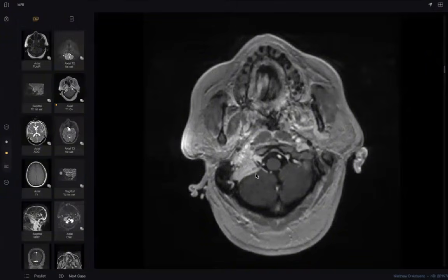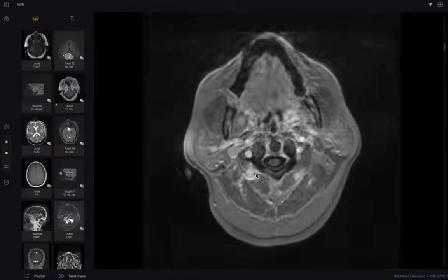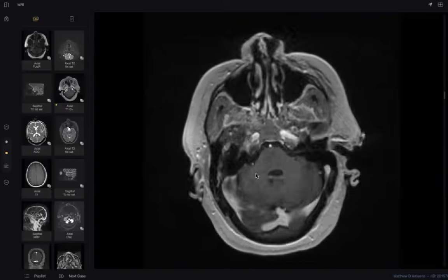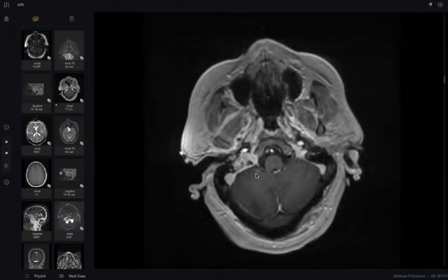Because it mainly lies at the jugular fossa, and on the MR venography I saw the dilation of the jugular. Could the lesion be glomus tympanicum? Also, I could not find extension into the middle ear cavity.